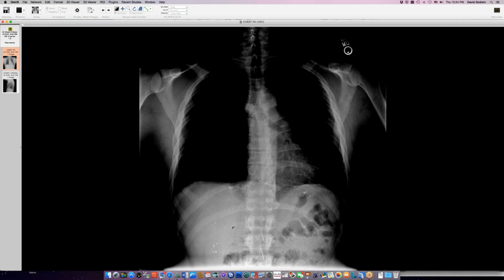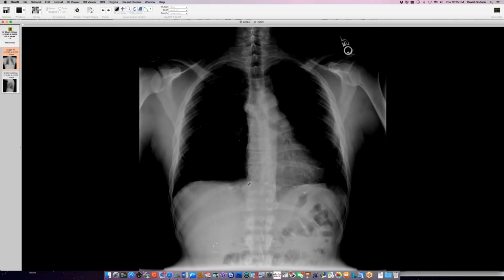And then I don't know how this stuff got down here. It looks as if it's actually in kidney, don't you think? How would this stuff get through? That would be strange. Maybe he's shunting. Maybe it's shunted across the PFO or something like that. Maybe there's acute hypertension. I guess it could. Okay, he's probably got it in his brain too, but he doesn't use his brain that much.